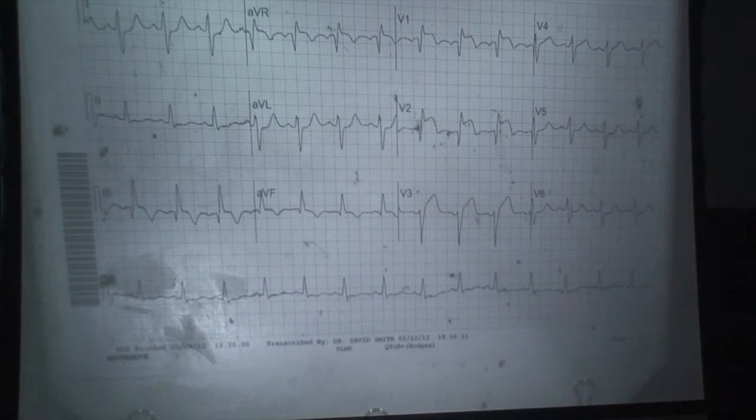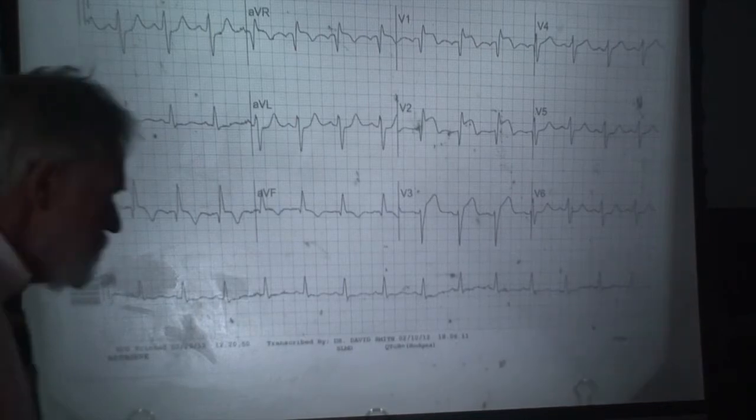But what's the other abnormality there? T wave inversion. No, Q wave. The QRS is long. It's a right bundle. Right bundle branch block. Now, if it were a left bundle, you couldn't see that injury pattern really. But with right bundle, you still can see ST elevation in the septal leads there. Okay. Yes.